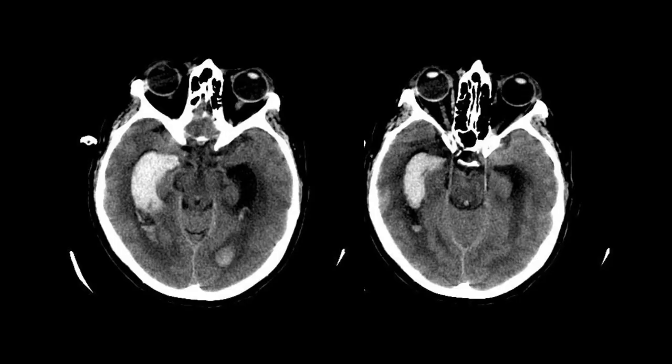So we've discussed trauma, we have discussed arterial hypertension, we have discussed amyloid angiopathy. Now let's get to our next pattern. So in this setting, we can see that we have some intraventricular hemorrhage. There's some blood in the lateral ventricle, probably also in the third ventricle and the aqueduct of Sylvius. There's also probably a little bit of subarachnoid hemorrhage.